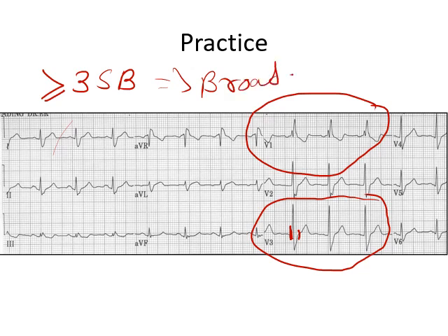Say this is the first positive deflection, so it is R wave and it is less than 0.5 millivolts, so I am labeling it as a small r. Then there comes a S wave, that is again a small negative deflection. Then there is a positive wave called a secondary R wave that is indicated by capital R dash. So this ECG is showing RSR dash pattern in lead V1.